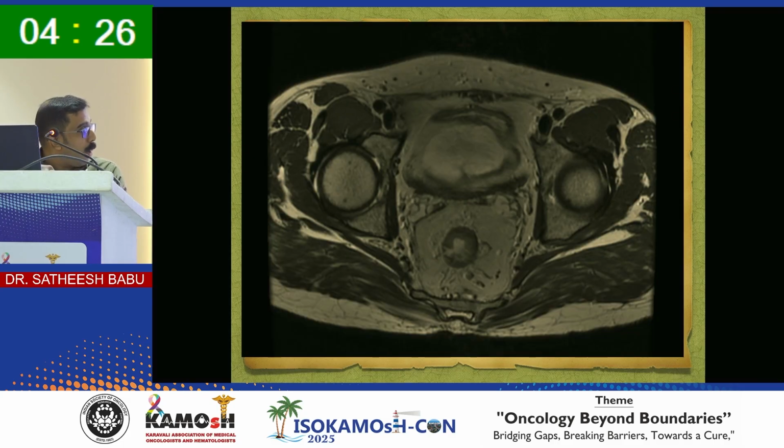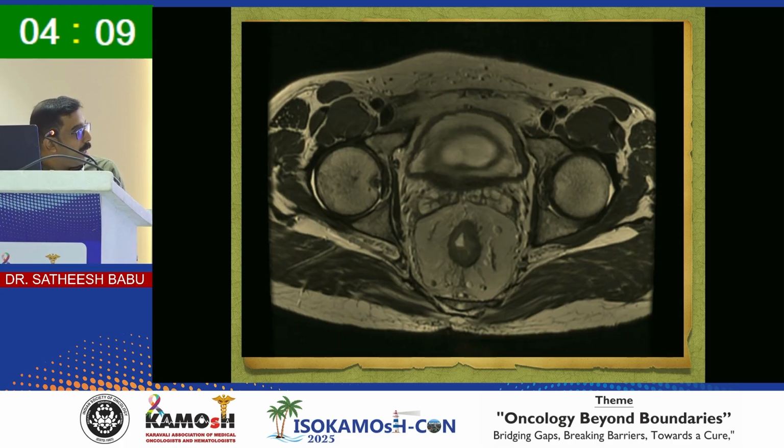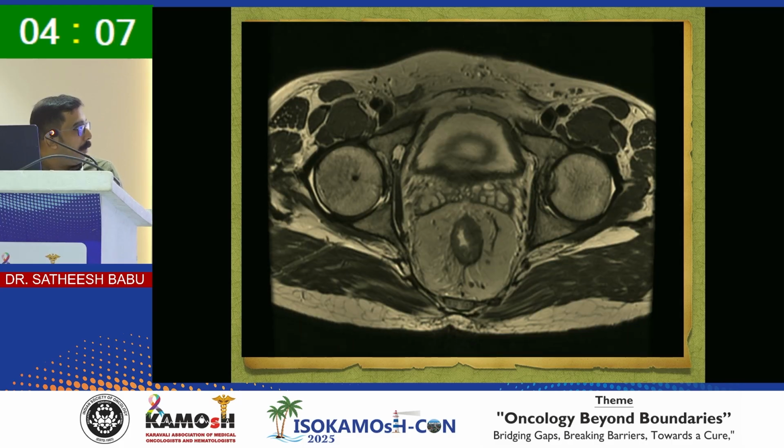You can see the small lines there. It is not tumor, actually it is a desmoplastic reaction. How will you differentiate between desmoplastic reaction and tumor infiltration? Desmoplastic reaction will be a very thin black line, whereas tumor infiltration will be a little gray. So here it is actually a T2 bar T3A, because in some area there is a small infiltration, which is that gray area. So that's a T3A. It can be treated with direct surgery, TME. You can directly go for TME.